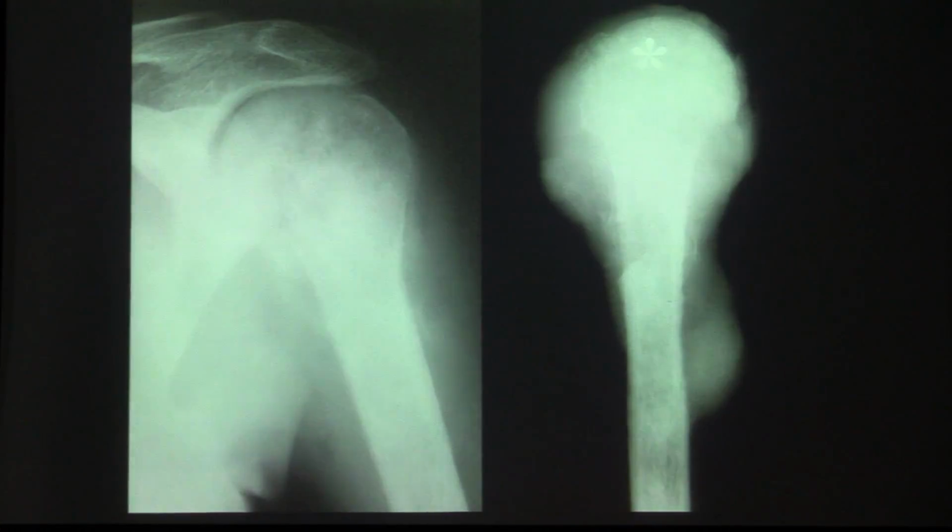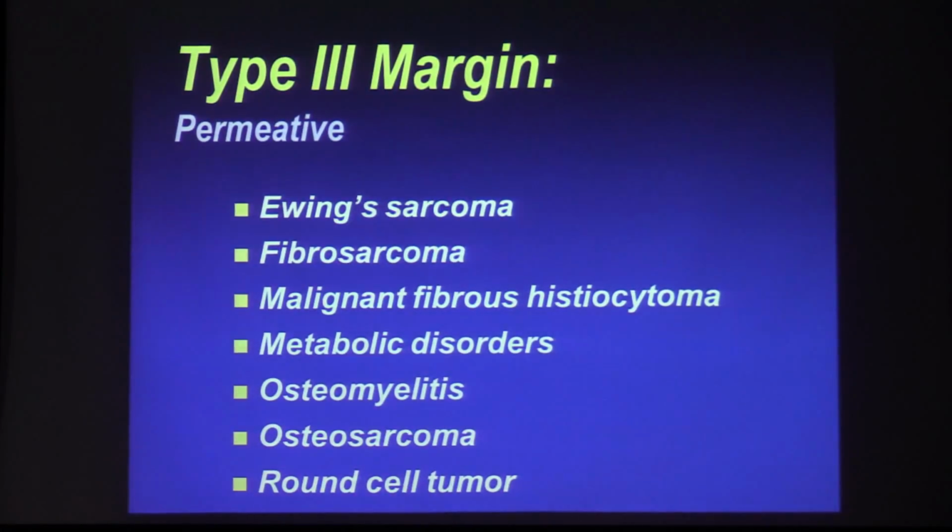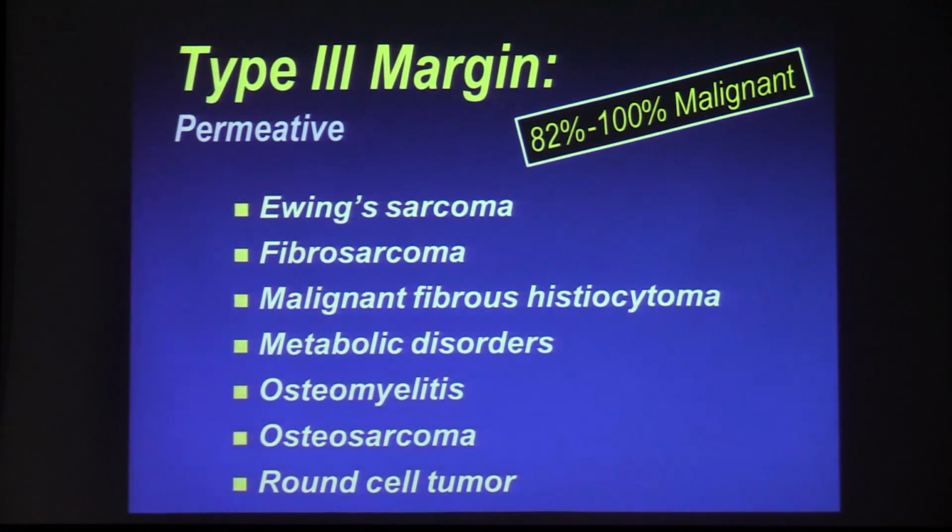On the specimen radiograph we see the same pattern. Perhaps when we look at that distal area at a little higher magnification, we can see that it really isn't quite normal, with these areas of cortical tunneling secondary to osteoclastic activity or bone loss centered on the Haversian system and the Volkmann canals, but still the same basic idea of maximally abnormal tending to go back to normal as we move along the bone. And certainly, again, lesions that are usually very biologically active, as you can imagine, most typically, but not invariably, malignant.